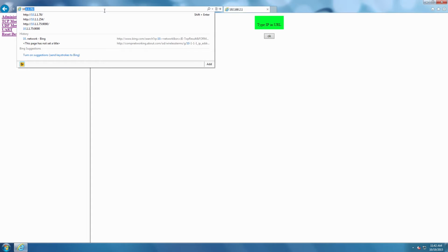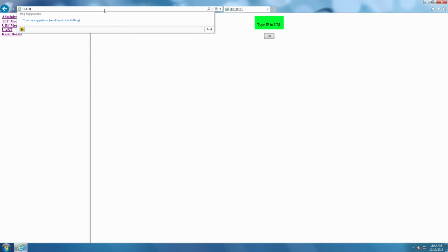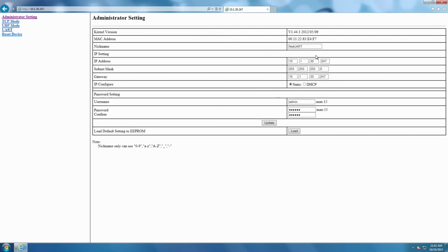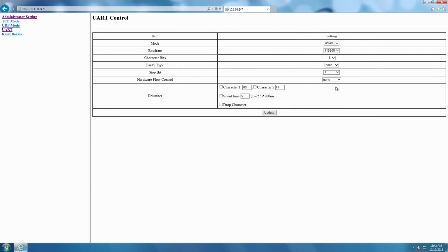After restoring the IP settings, go back to the web browser and type the IP address that was assigned to the CT701 into the address bar of the browser. You should be able to connect to the CT701 over the facility network. If you cannot connect, verify the IP settings of the Tek bridge and consult with the IT department of the facility the equipment is being installed in. If desired, you can log in and check that the CT701 has retained its settings.